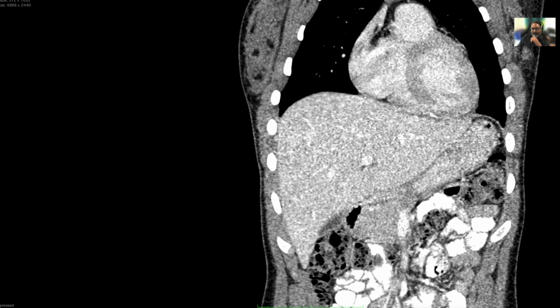However, if there's a mass or fluid here, there are three things together: the liver, the diaphragm, and the pleura. And then there's the lung. All three of them just look like one space, unless there's gas, air or water. When we do this area again in the thorax, when we do the lungs, we will see how pleural fluid can get here, air can get here, and sometimes you can get air under the diaphragm. That's what we'll do when we do the abdomen.